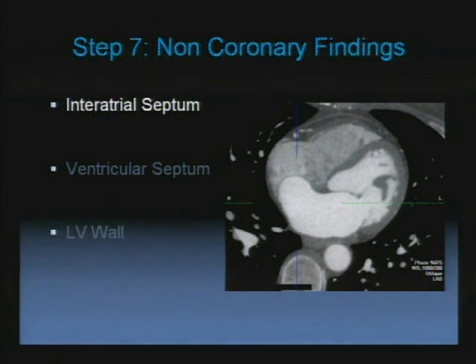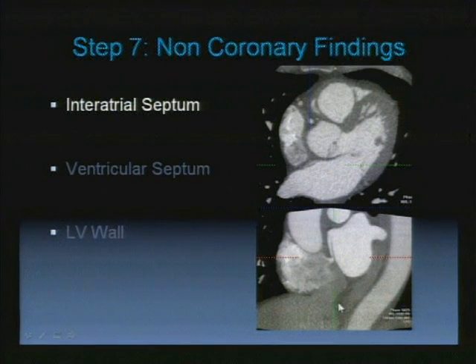If I don't force myself to look at parts of the heart, I'll miss stuff. So this is a dramatic thing, and I know Sanjeev is going to show you some atrial abnormalities later, but here's a patient who's got an aneurysm of the interatrial septum. But more often on the axial views, you'll see this, where the septum primum and the septum secundum is separated.